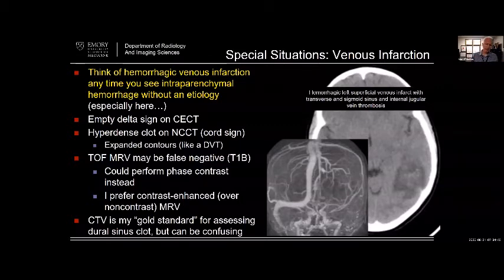The way we do our CTAs is at equilibrium so that arteries and veins are filled. So we typically will get a look at that, but depending on their cardiac output, it may not be a fantastic CTV at that point. So if we're focused on CTV, we try to do the CTV, but sometimes you don't know and you end up taking a look at both. So that's something to look for.